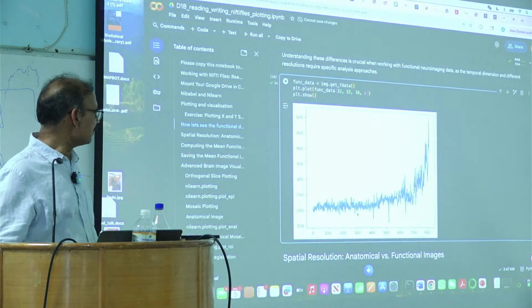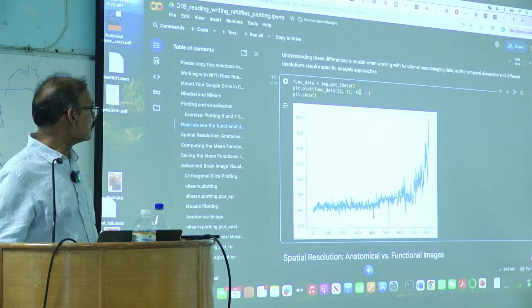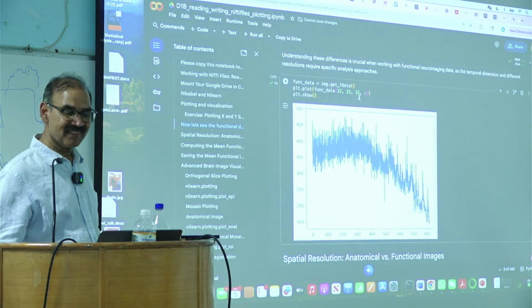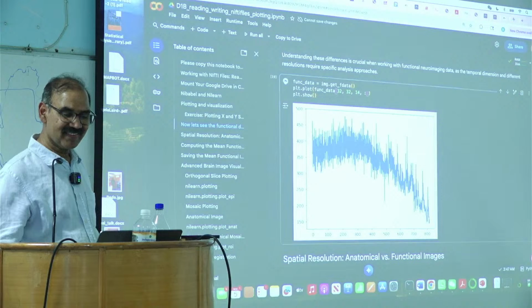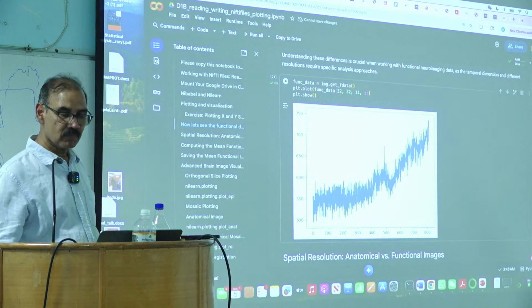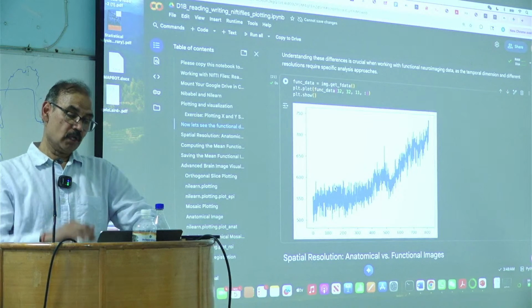It's a little worrisome because it would suggest that there is a slow increase, right? So what we could do is change the slice and see what is happening. Okay, so it shows that in the center there is this slow drift which is present.